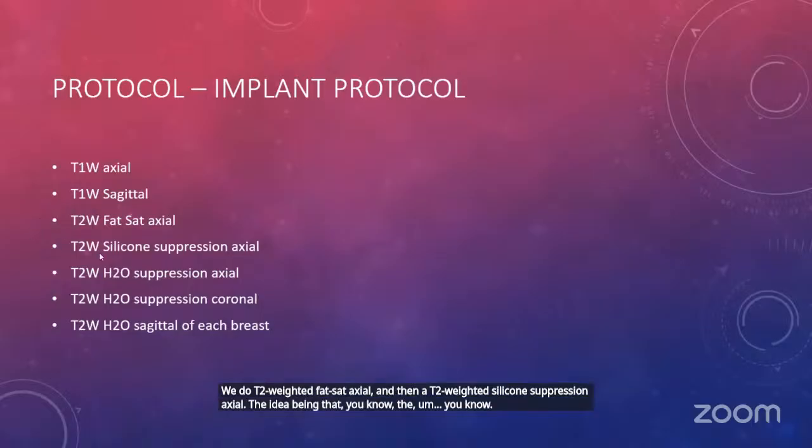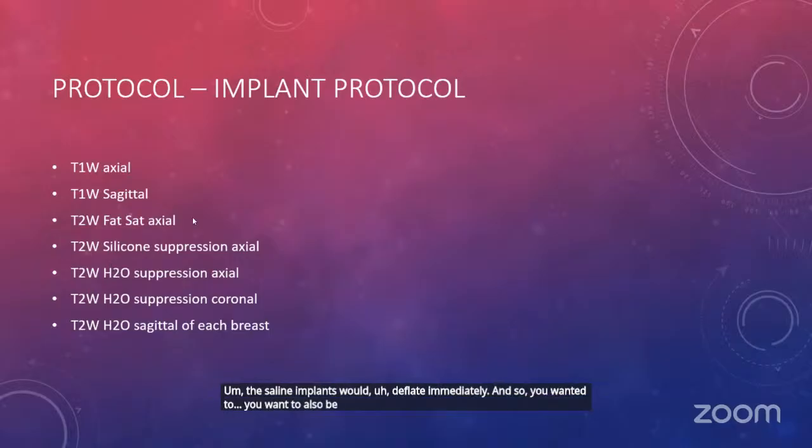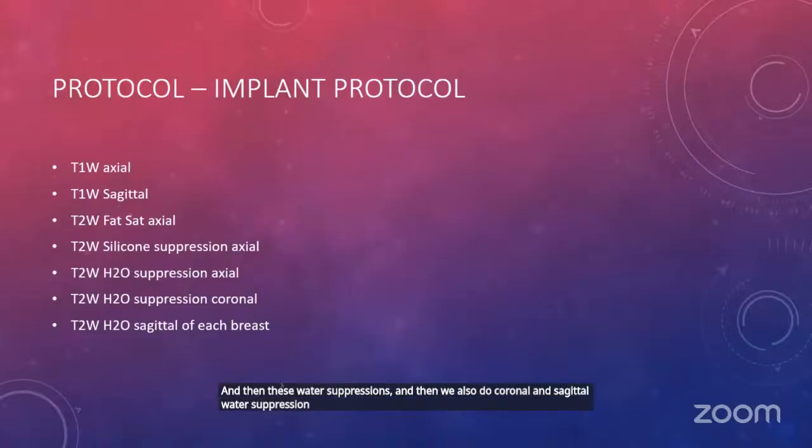the implant ruptures that are clinically silent, of course, are these silicone implants. The saline implants would deflate immediately. And so you want to also be looking and making sure nothing in the breast is free silicone. So that's why you do these silicone suppressions and then these water suppressions. And then we also do coronal and sagittal water suppression T2 weighted images as well.